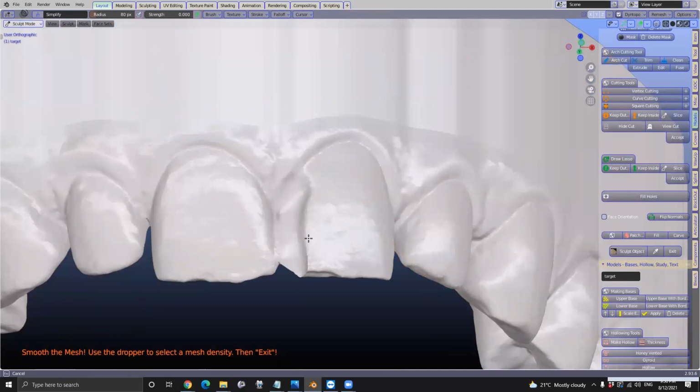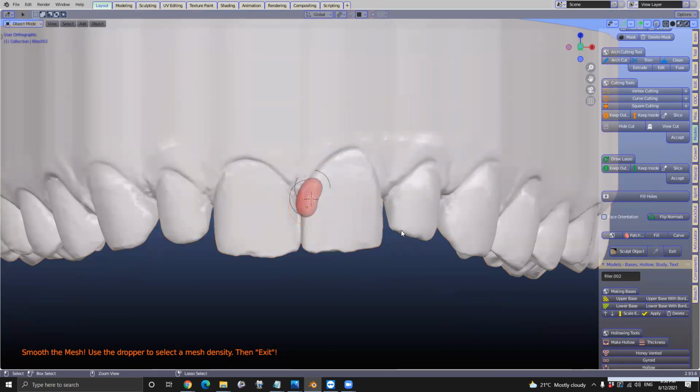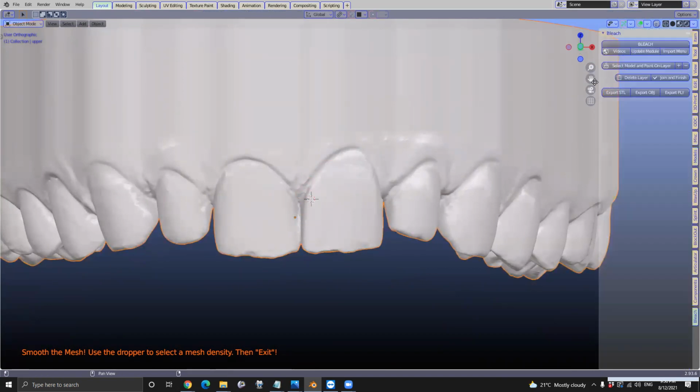Yeah. Okay. So you could do this similarly with the bleach module. You're painting on a layer, but then I suppose you've got to modify that and turn it into a surface. Yeah. Okay. So assuming we were using the bleach module, I'll just demonstrate.